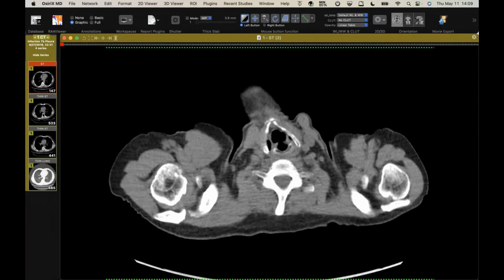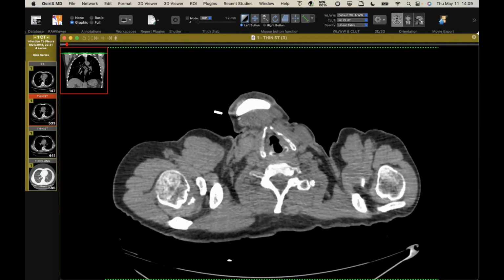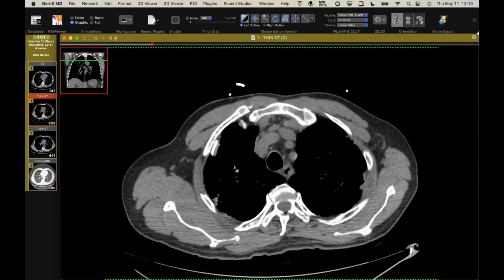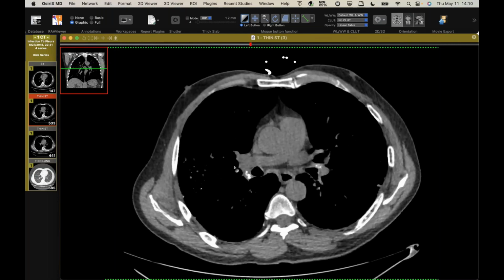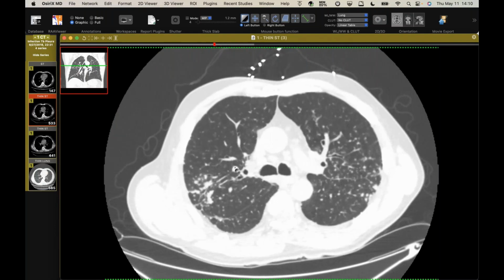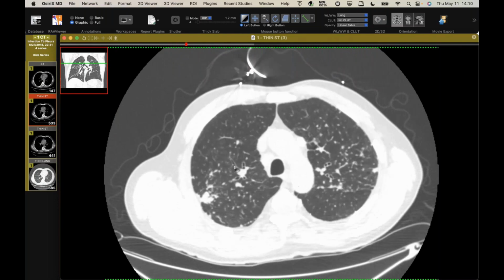All right, so this is a middle-aged person whose occupation is a school teacher and has chronic lung disease and has a pleural plaque. So there's been some asbestos exposure, but you can see these calcified nodules. And then there are these chunky calcified mediastinal and hilar lymph nodes. And you can see all of these perilymphatic nodules in both upper lobes predominantly, but all throughout.